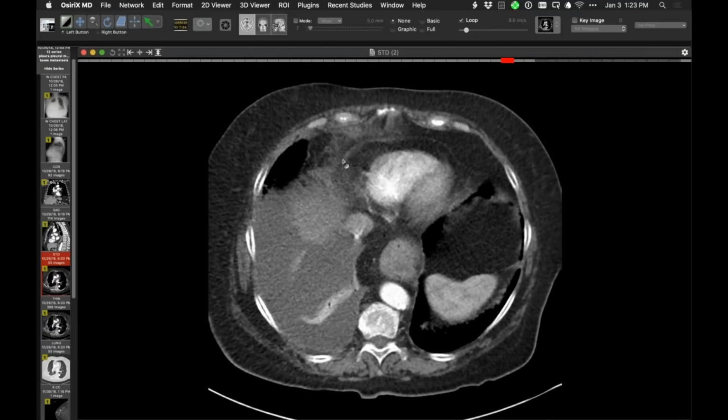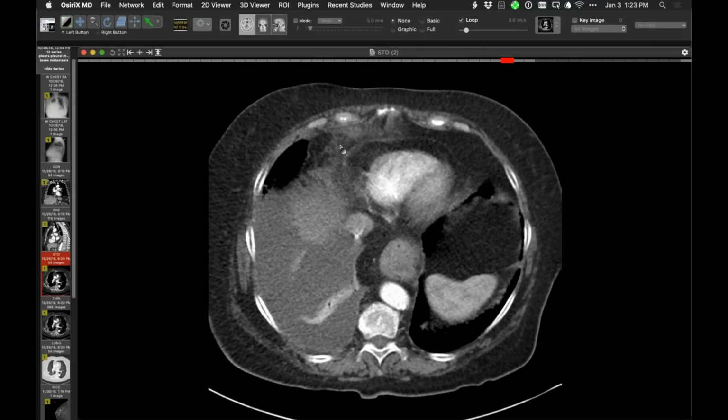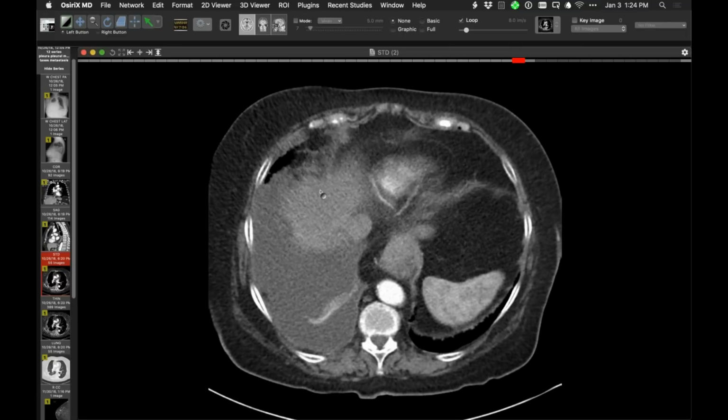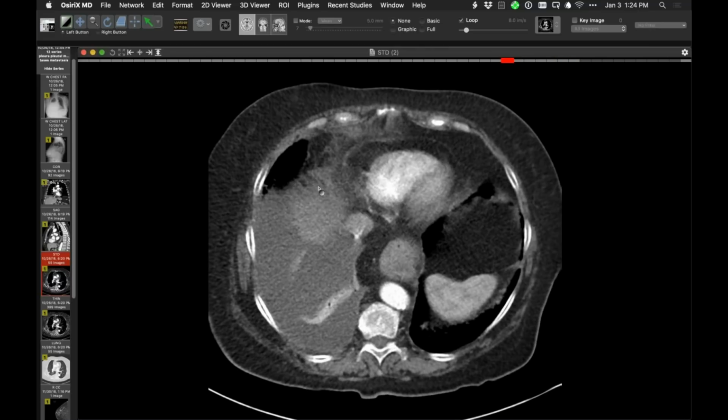And the other thing that I look for in this particular context, which this person doesn't have, but if you see those findings, even if you see the smallest lymph nodes in the fat, the cardiophrenic lymph nodes, even more concerning for pleural tumor. Yeah.